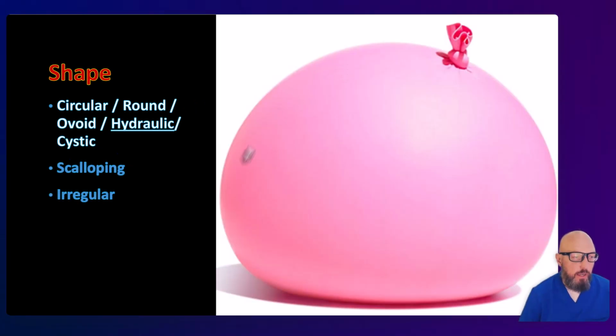And so this is what I'm talking about. When I see something, maybe it's in the maxillary sinus and it just conforms to the sinus floor, you might start describing that as cystic or hydraulic. It's a strong indicator of cyst, although benign tumors can occasionally appear similar.